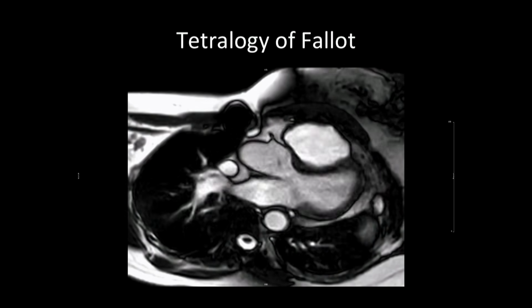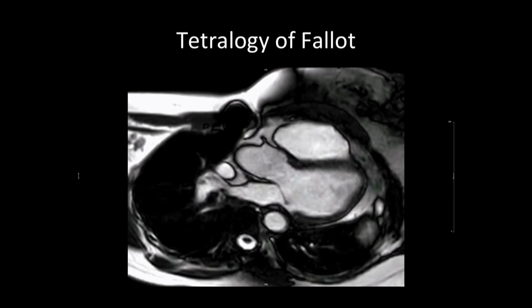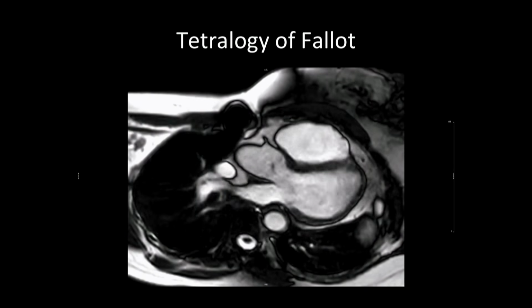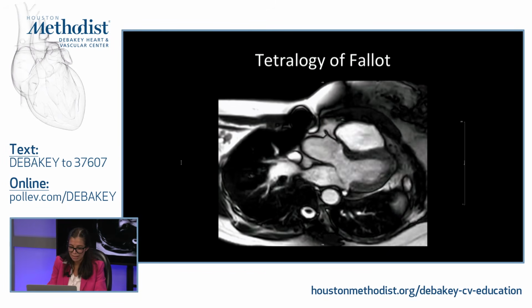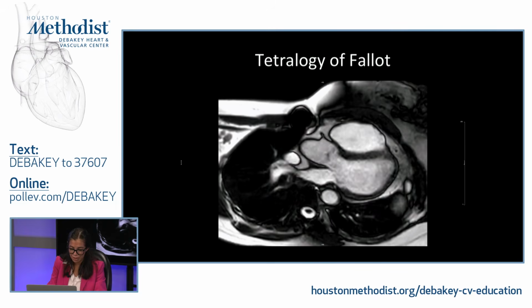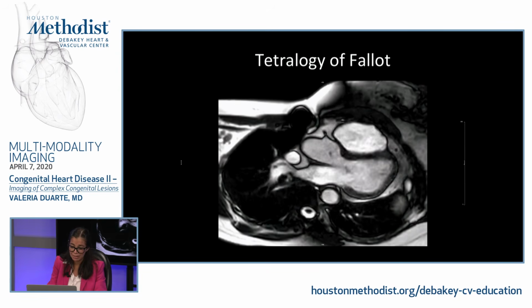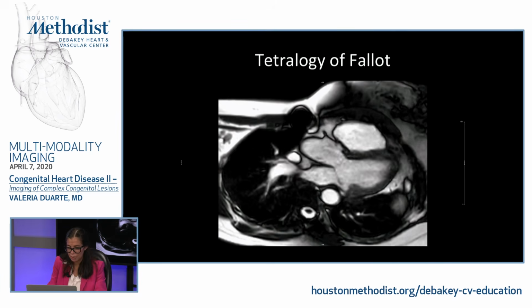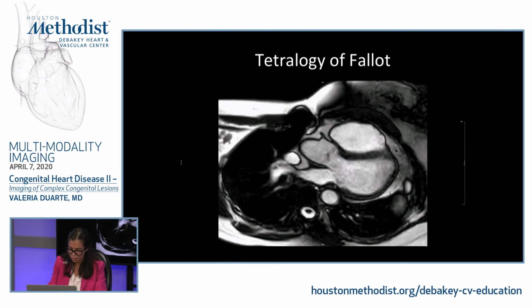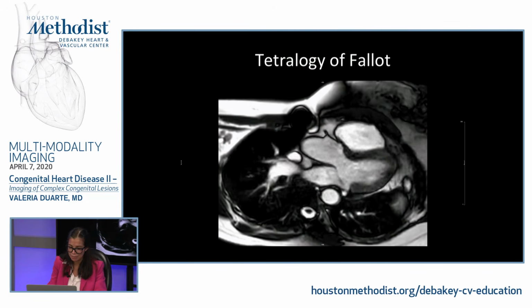If we follow the septum from the apex up, we can see where it ends, just by looking at thickening, and then we see where the patch starts and how the aortic valve and the aorta are overriding the septum. We see the patch that doesn't thicken, of course, and that it appears to be intact.